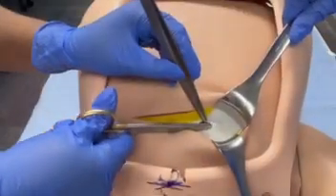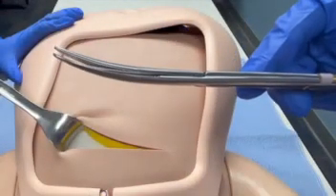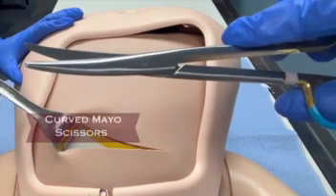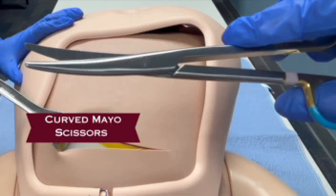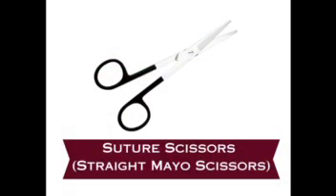To dissect through the fascial layer or other dense tissues such as ligaments or vascular pedicles, heavy-duty and sturdy scissors, called Mayo scissors, are used. Curved bladed Mayo scissors, or curved Mayos, are used for cutting or dissecting, compared to straight bladed Mayo scissors, which are solely used for cutting suture, and are appropriately referred to as suture scissors.